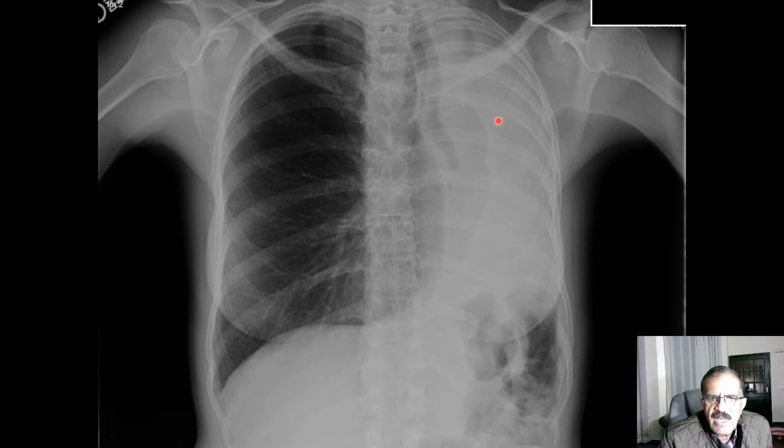So I think some main bronchus problem. Perhaps this bronchus is blocked here. If you can trace the bronchus, suddenly it stops here. Probably there is some foreign body, some malignancy, which has caused complete occlusion, complete blockade of the left main bronchus, resulting in left lung collapse.